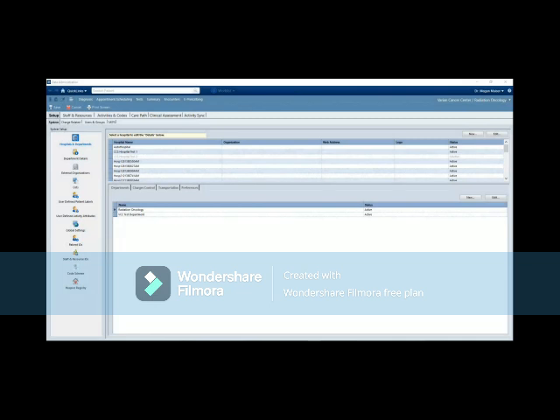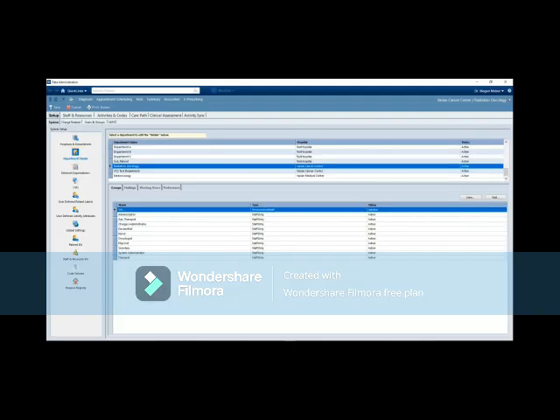The system administrator will create and add scheduled holidays to the clinic's ARIA system in Data Administration. Select the Setup tab and then the System subtab. From the System Setup panel, select Department Details. In the upper section of the Department Details, choose the department and hospital to create the holiday. In the section below, select the second tab Holidays.